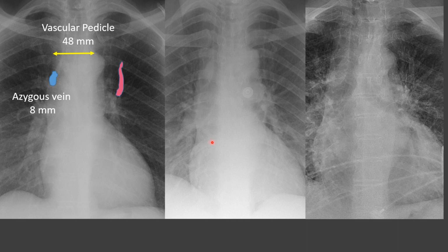Now, he's presenting with acute shortness of breath. And so what are the changes that we notice? So for one, the SVC we could see is just a little bit more prominent. It's off of midline more than what we saw last time, right? So we can see the SVC is all the way out here now, and then we can see where it intersects the bronchus intermedius, so down here. So we drop a line. We can measure the width from the origin of the subclavian artery to the outer edge of the SVC there, and we can see that the vascular pedicle width has increased. It's now measuring 64 millimeters, greater than 60 millimeters, so it's widened.